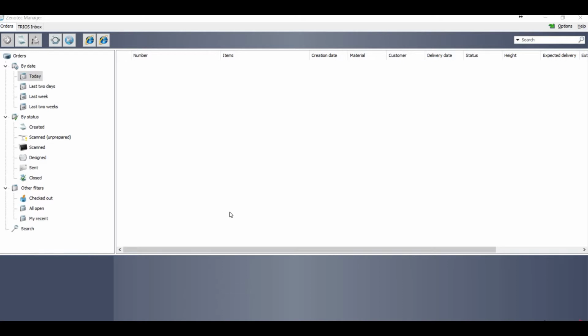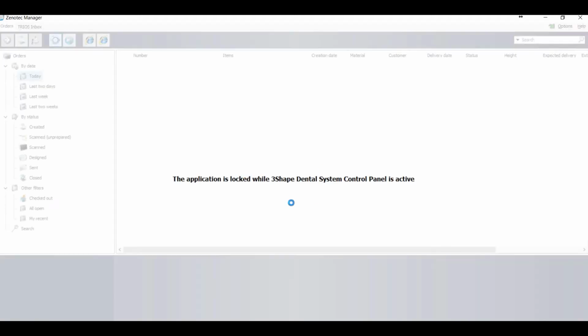This is the first video towards the step-by-step training on 3Shape. Today I will talk about how you can create orders for different types of restorations, and I will show you how you can change some settings regarding the order. So first we go to the settings, and we will see what we can do in settings regarding the orders.